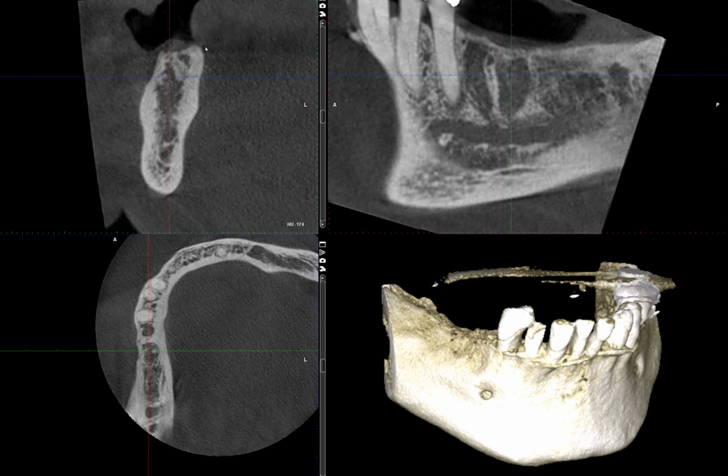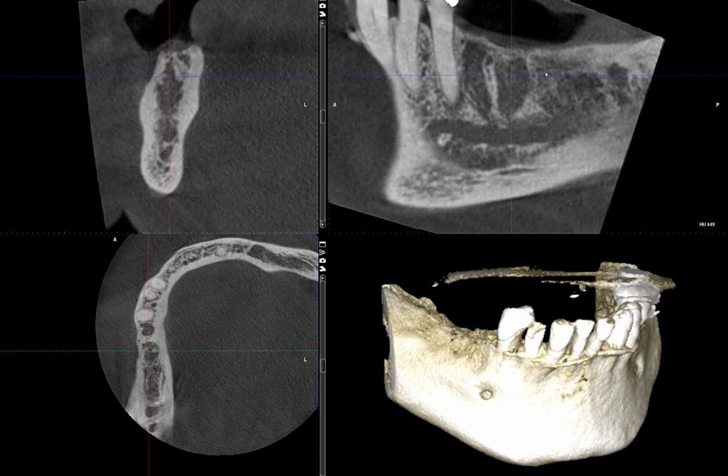healed and the alveolar crest is intact, the trabecular bone of the extraction socket may never be exactly identical to the surrounding structure. And this could be due to patient's age and ability to remodel the bone, which is exactly what happened in this case. It just doesn't have the same radiographic density as the surrounding trabecular bone.